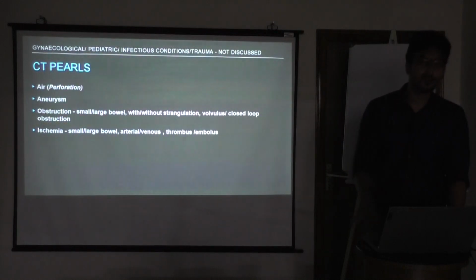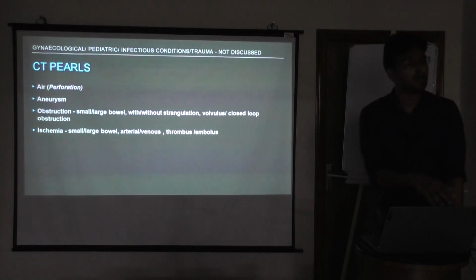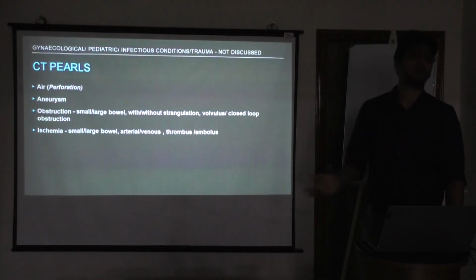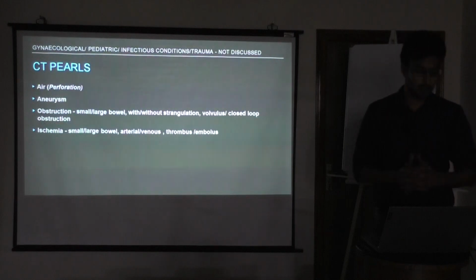Even orthopedicians will relate. But in CT, air is a bad thing. What I am trying to convey is, air in an abnormal region, let's say if the patient is not passing flatus, it must have been collected somewhere else. That's a bad thing. So if you see air on a CT abdomen, you should always be very careful.